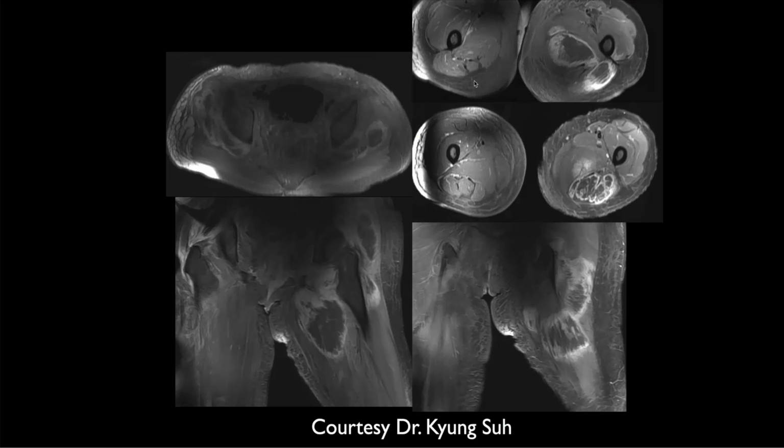Now, so whenever you see this and you wonder about that, what are the things you think about? Like an infection. Could be infection. This would be a pretty diffuse infection on both sides, but that's right. Like a tumor with internal necrosis. It's a lot of tumor here. Tumor, but I guess so. Is in one side or one compartment. You can think about compartment syndromes.